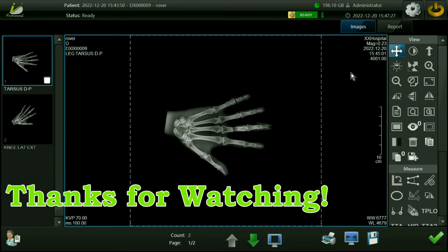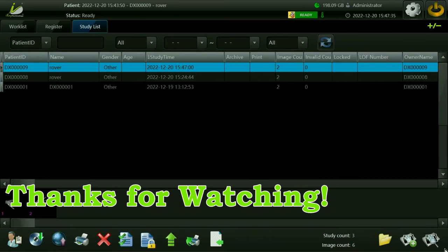There's some other tools here. I won't really get into them now because you probably won't use them. Everything we just went through is probably all you will need. And of course, we're always here if you have any questions, and manuals will be provided and everything else. But pretty intuitive, pretty easy to use.